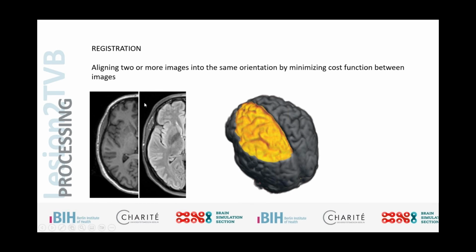There are different versions for this, depending on whether or not we have the same representation of intensity values. For example, this is one of the differences in T1 and T2. We see the change from the gray matter being a dark gray to the white matter being rather a light gray, as opposed to the FLAIR image where the gray matter is represented as white, and the white matter is actually turning more into a gray and to a darker gray.